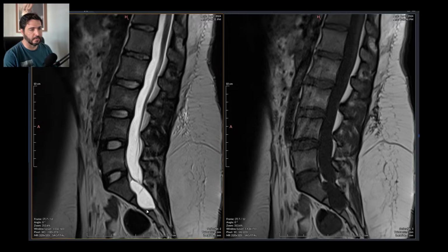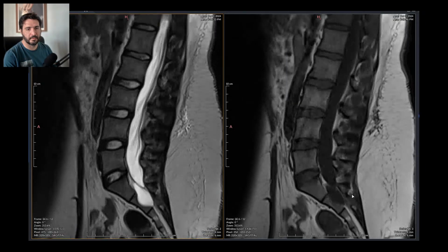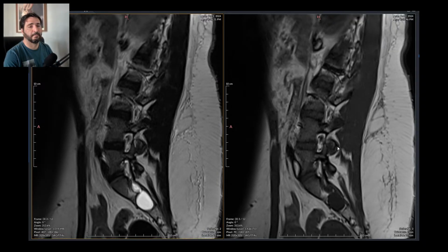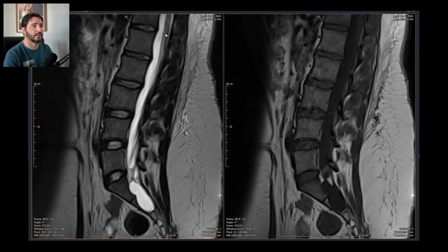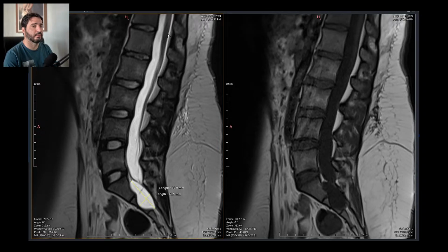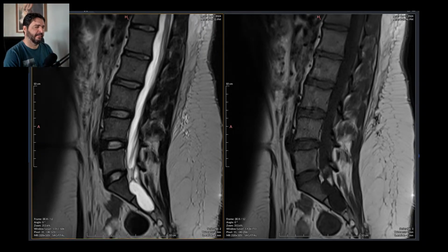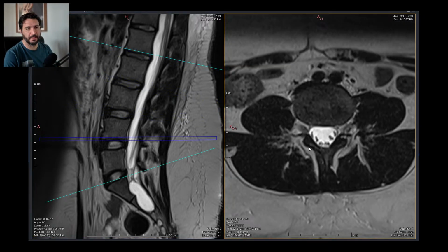There is some, not destruction, but there is some deformity of the sacral canal. This is quite common because this is a slow growing persistent lesion. Just going to write that down. It's 4.7 by 2.0. All right. Yep. And there is no protrusion or extrusion. The spinal cord is well positioned. The nerve roots as well. Oh, I'm so sleepy. I'm sorry. It's been a rough night.